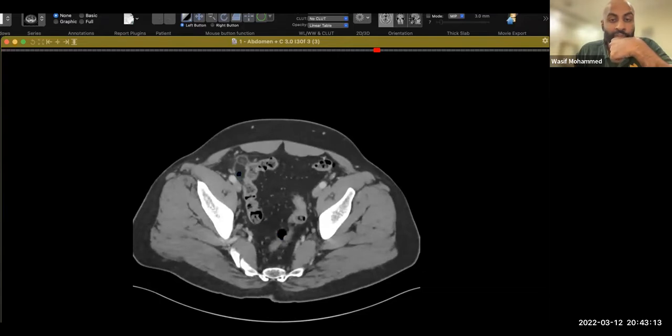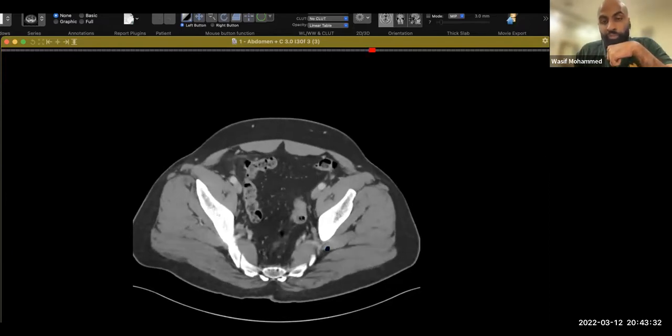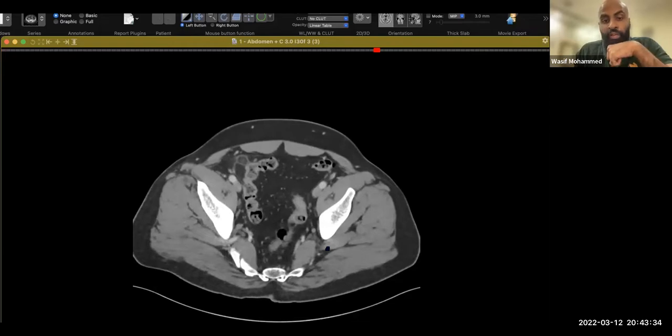So here you have some thickening of the peritoneum, you have the central dot, and you have this hyper-enhancing, or rather just thick wall surrounding this fat pathology. These are classic features of epiploic appendagitis. There's some fat stranding. Your pertinent negatives were on point. There's no pneumoperitoneum, there's no free air. And when you say there's no free air, also mention that, however, I would confirm this on lung window images. They love to hear that.